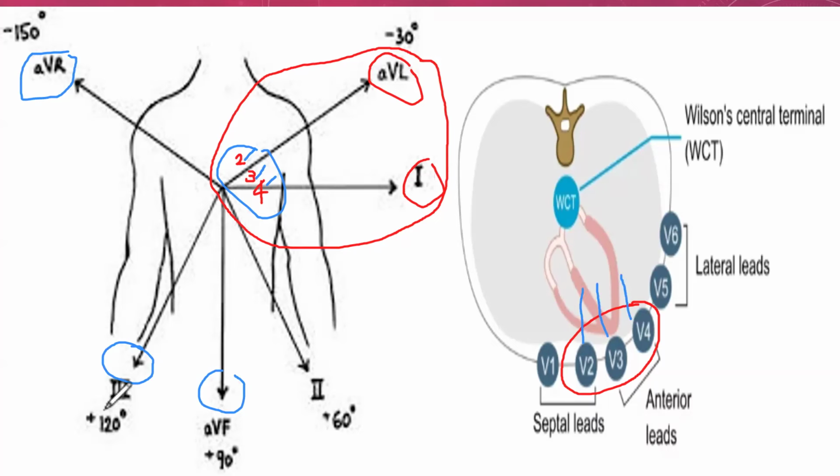You would expect them in similar areas, in lead 2, because it's also looking at them from the bottom here. So you've got to imagine lead 2 sitting at the bottom and looking up at what's going on over here. I hope that makes sense. If it doesn't, please stop me. I don't mind, I can always explain it again. But basically what we are saying is that we expect to see reciprocal changes in these leads, considering that we had ST elevations over here.